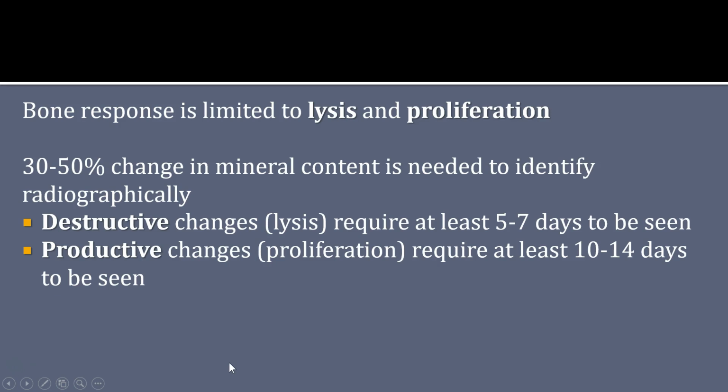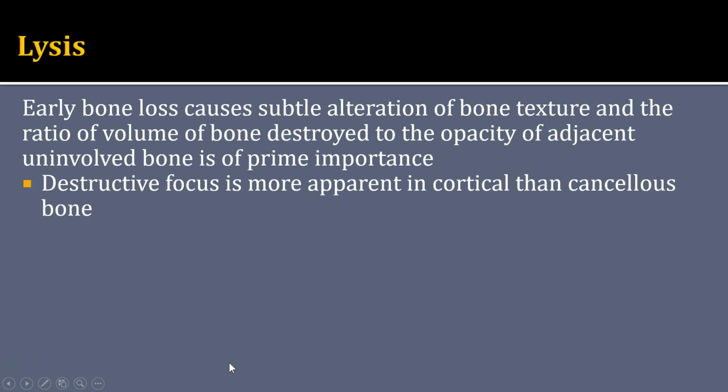Finally, the radiographic alteration may lag behind clinical lameness in some disorders, such as osteomyelitis, or may actually precede the clinical signs of lameness, for example, often in malignant bone tumors. So radiographs are going to be fairly nonspecific and may or may not have changes at the time that our patient presents. Let's start out talking about lysis.